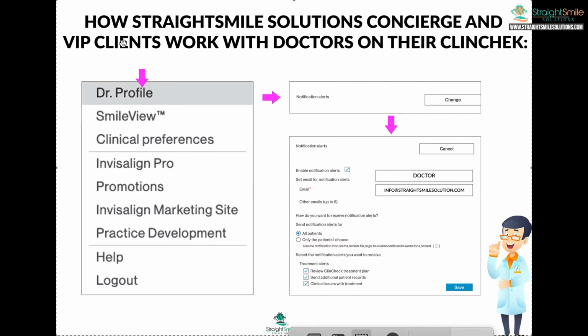So your choice. But if you just go to your doctor profile, and by the way, if you've never had someone look at your doctor profile, let's do a session. Let's look at it. Let's optimize it. You'd be surprised at things you don't even know are there, benefits you maybe don't even know you have. Look at it from the perspective of someone who understands Invisalign and the doctor profile. You can get so many more referrals and patients if you optimize this.